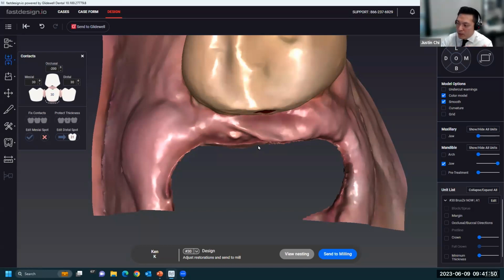And going back to the preparation, hopefully this helps you understand how you need to establish really good adjacent surfaces for your cases. So we're focused on the tooth we're prepping. But as we're prepping, before you take your scan, you don't want to forget about evaluating those contact surfaces of the adjacent teeth. You may need to modify that in some way. If it's overlapping your margin, that's going to be a big issue with your final restoration. If that surface is rough, that will also not allow you to create a nice, solid, broad contact in your restoration.